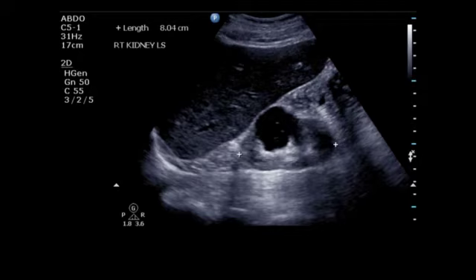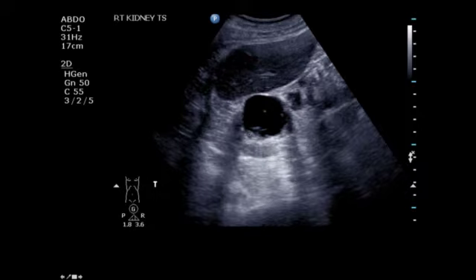This time we've got a small kidney. Now, often end-stage renal failure kidneys do develop small cysts. This has got a cortical cyst in it. There's tiny little bits of echogenic material within that cyst, and perhaps a nodule and some solid tissue there. And so I think for the non-radiologist, non-advanced ultrasound practitioner, certainly that would be one to refer.